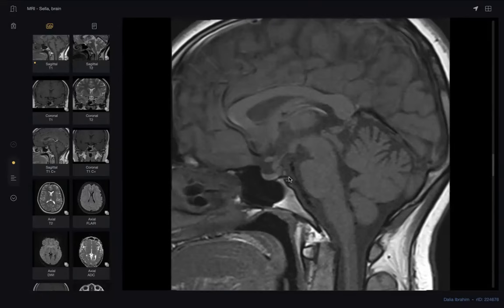You told me hypophysitis. Okay, excellent. What else? Hemorrhage, something relative to hypophysitis. Okay, don't worry. What is the association of hypophysitis? Granulomatous hypophysitis. It could be a TB hypophysitis or sarcoid.